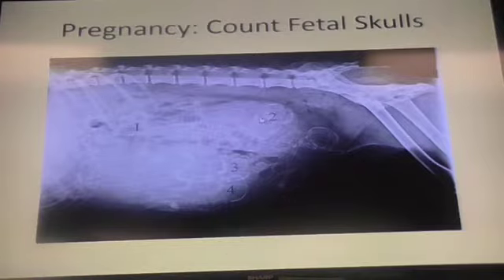And you're looking at a semicircular shape opacity. And where you see where these plates of the skull meet, that's the open fontanelle. Everybody see that little area there? Okay.